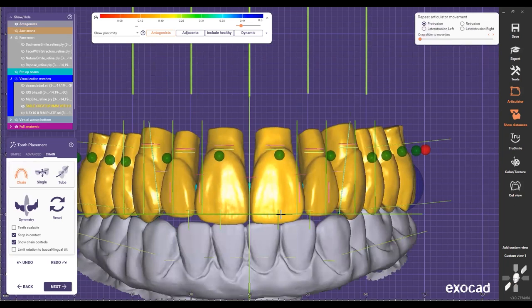I communicate that to the dentist, saying, hey doc, I'm gonna leave space in the lower anterior area, but we're gonna fix it later. Or we can leave it open, and then you just explain to the patient that it's gonna have a gap right there, and then we can fix it for the lower. So now we don't compromise anything, and it just makes everything much easier that way. But that's something that you have to communicate. I want to do it that way, but I need to communicate with the dentist, so both are on the same page.